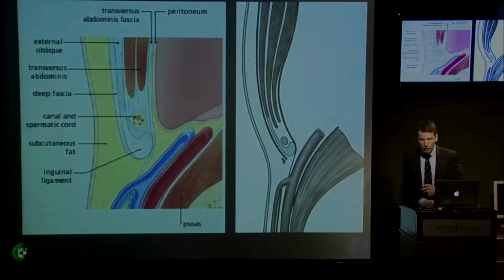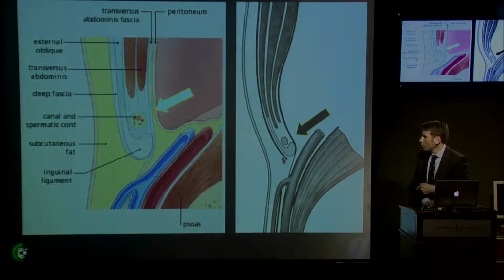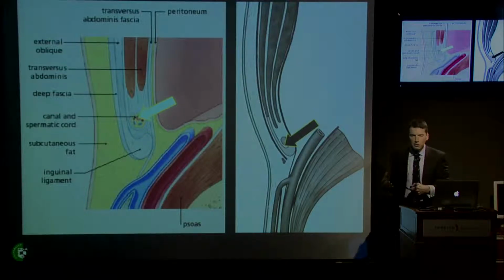So what does it look like? Well, if you're looking at the inguinal canal in its short axis, this is a sagittal anatomical plane, you're really looking for the peritoneum and bowel to push in and compress the canal, but there's no actual defect or hernia.